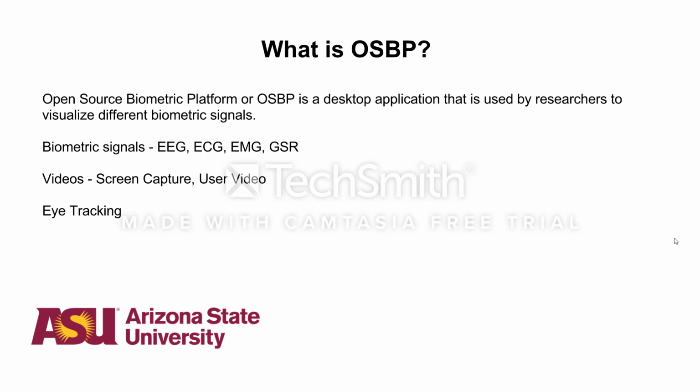So we are taking care of four biometric parameters, which are electrocardiography, EMG, which is electromyography, GSR, which is galvanic skin response, and the fourth parameter is EEG, which is electroencephalography. Now this application will basically help researchers to visualize different biometric signals along with eye tracking through the medium of videos. Now next, Ritika will take care of the next section.